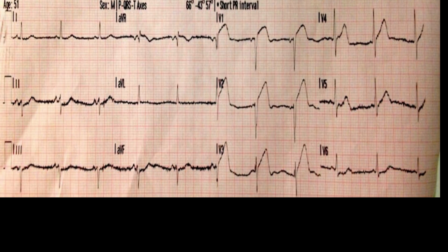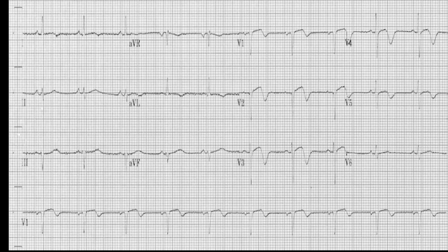But if you have a history that the patient came to you a week before with anginal symptoms, at that time the patient should have had which pattern? Inverted T wave or biphasic T wave, right? And after 1 week or a few days or few weeks, the patient may develop a full myocardial infarction, right? So is it making sense? So we have another ECG.